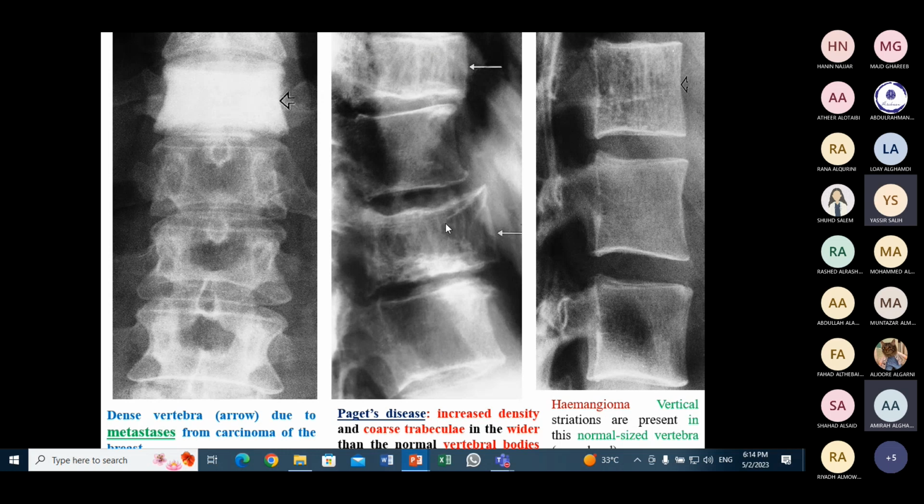And if you look to the size of the vertebra, it appears more expanded or more enlarged than the normal one. لاحظوا دي هي AP diameter. This also is more enlarged, and there is an abnormal trabeculation. This is an abnormal trabeculation pattern.